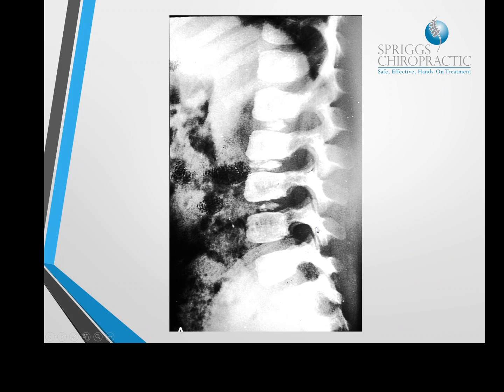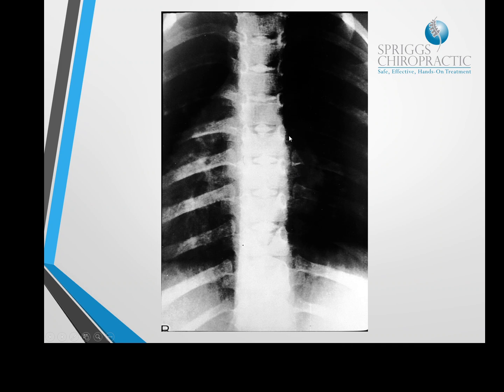Here it is in the lumbar spine, again in the peds case. It's an immature spine, and we've got HADD deposits within the intervertebral discs. Here we've got it on an AP thoracic spine, and it's spread out amongst basically all of the thoracic vertebrae. So this one in particular is going to be quite idiopathic in its nature.